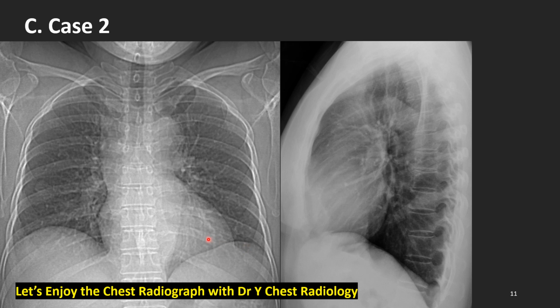Case number 2. This is a CT scanogram, not just a radiograph. What do we see? The descending thoracic aorta line is okay, no problem. How about the paraspinal stripe? Yes, bulging contour, well-defined margin, obliteration of the paraspinal stripe.